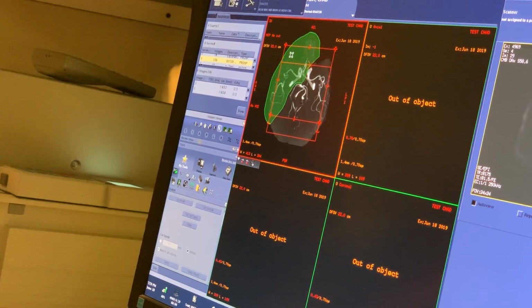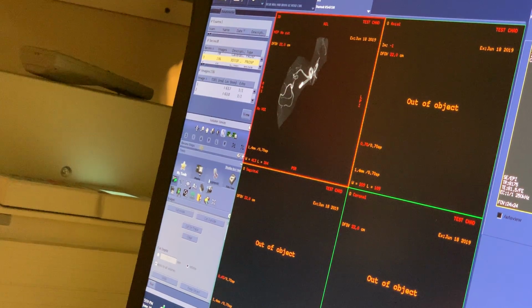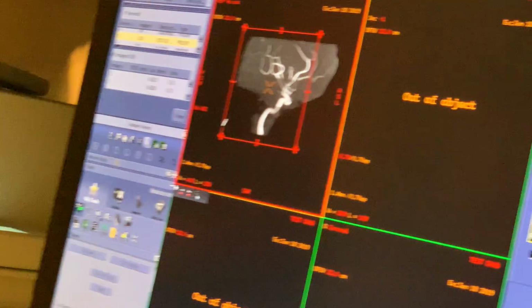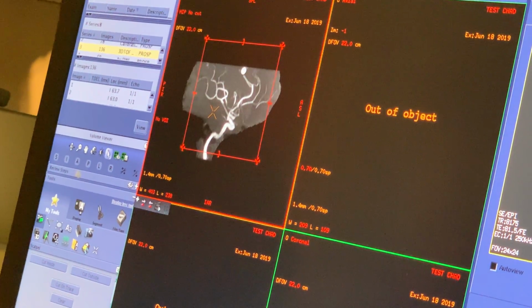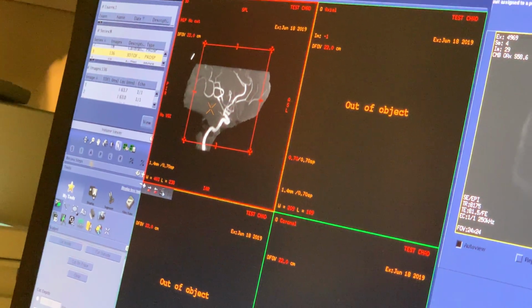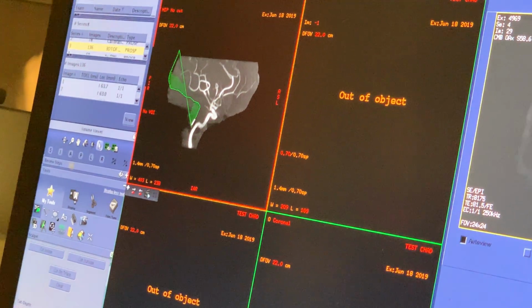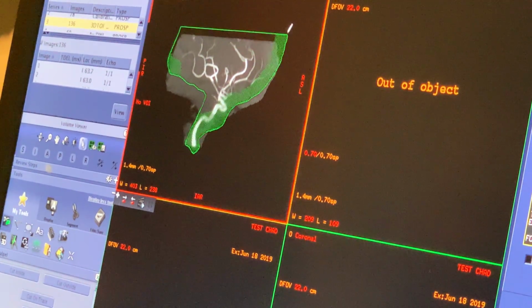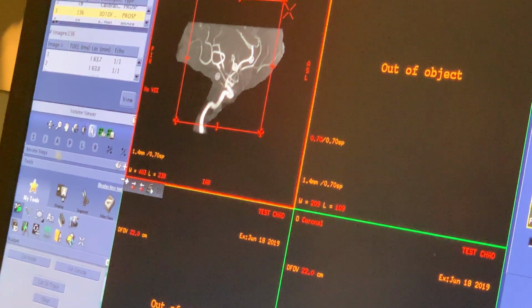So now that I've circled the right circulation, I click cut outside. All right. So this is just the right side. Now what I like to do is right click and go center on object, which puts the object right in the middle. And then we'll go around and cut out some of this extraneous area where the brain really doesn't exist. I leave most of the territory alone. I cut outside, so I trim it up a little bit.